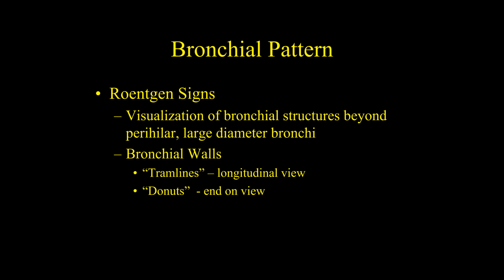Okay. If you turn those bronchi now this way, it's going to look like little train tracks or little parallel tram lines, if you will. That is the same thing as the donuts, but now you're seeing them in longitudinal instead of end-on.